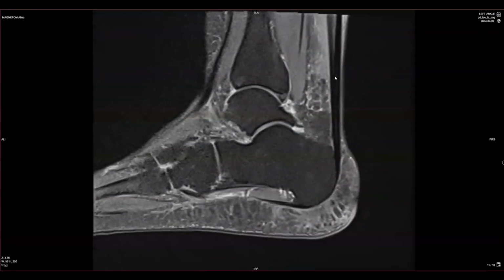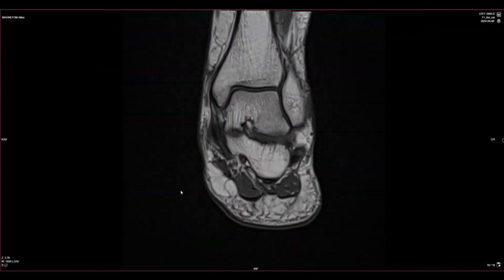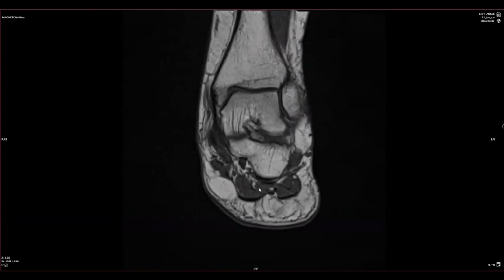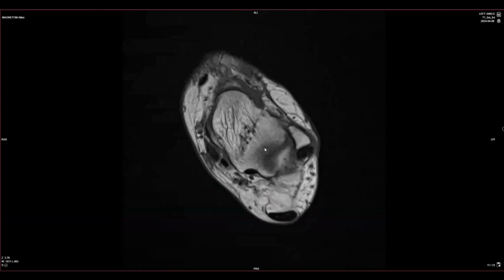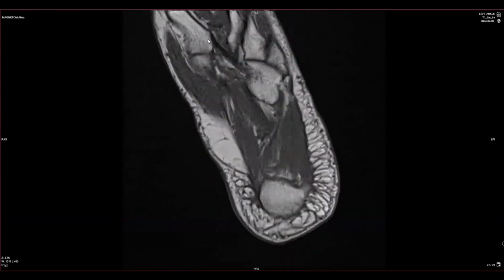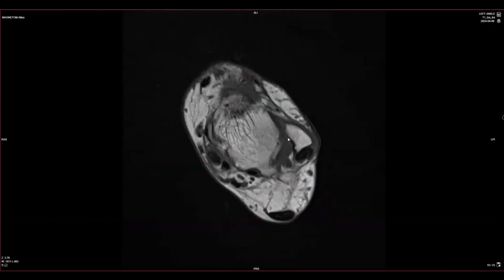Let's do your Achilles, mild tendinosis, peritendinitis, no large Haglund deformity, plantar fascia, central cord thickening, periaponeurotic edema. Let's make sure we assess for the presence of muscular atrophy. This is questionable. There is mild atrophy in some of these muscles. Let's take a look on the axial images and see if we can see in the forefoot a bit. Still not sure if this person truly has neuropathy. Of course, I'd check it anyway, but this is equivocal to me.